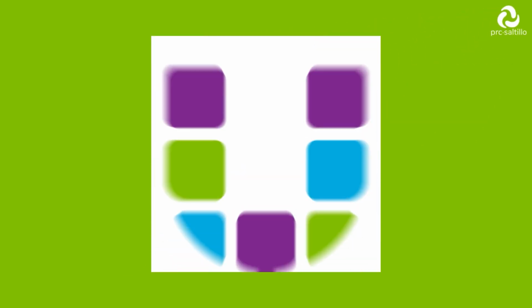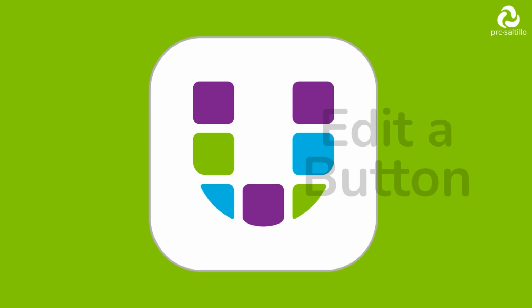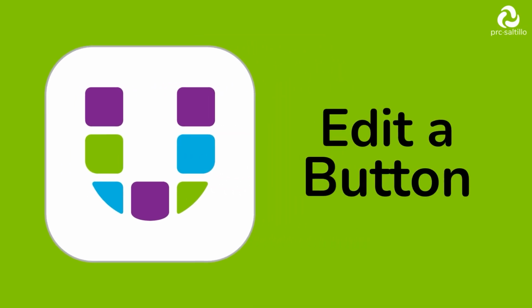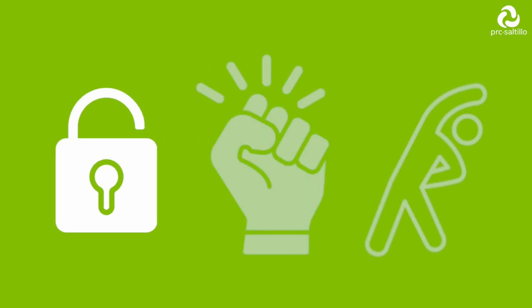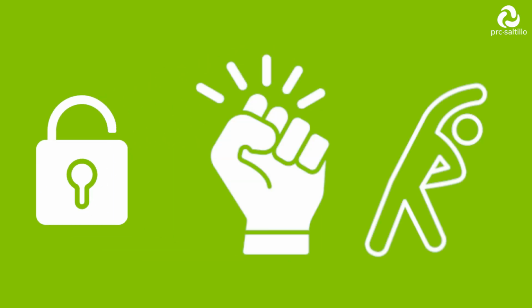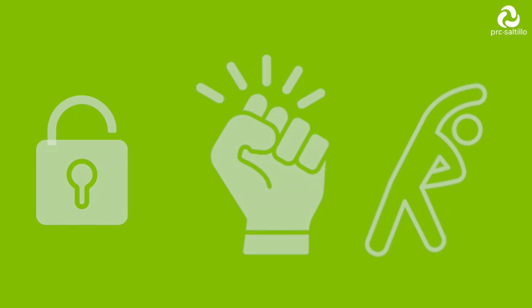Today we're diving into something simple but super useful: how to edit a button in the Unity AAC app. Unity vocabularies are built to give AAC communicators access to powerful, flexible language. But here's the thing: every communicator is unique. That's why being able to customize your vocabulary is such a game changer.